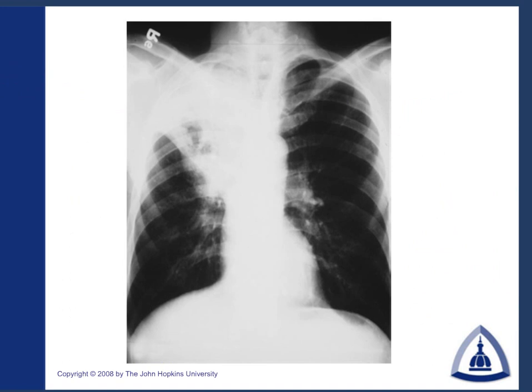This happens to be a man with sputum production, cough, high fevers, and sweats. And this is tuberculous pneumonia here. Right upper lobe infiltrate, and interstitial process, classic for TB.